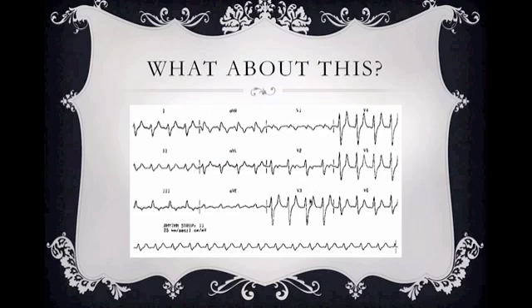All right, what do I got? I got a symmetrical T wave, peaked. Here you can see it really good in V4. Symmetrical T wave and peaked. All right, that is another classic hyperkalemic T wave.